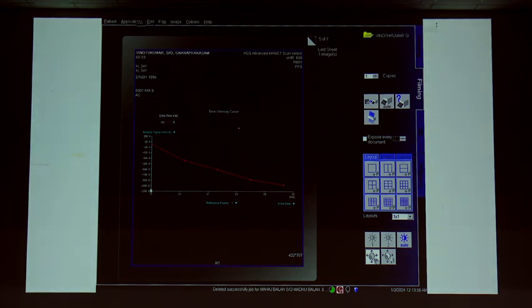Why are we starting this? By seeing morphology, our eyes pick up only the defects. In stage 1, especially stage 2, we were not able to pick up changes by eye from the signals. Before that, confidently the T2 star will be higher than normal.